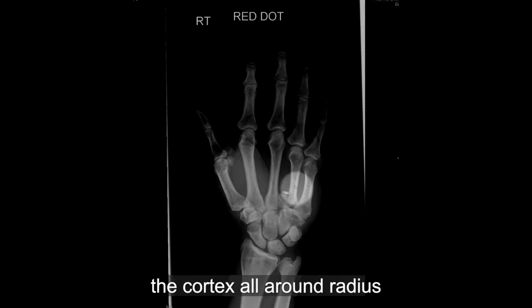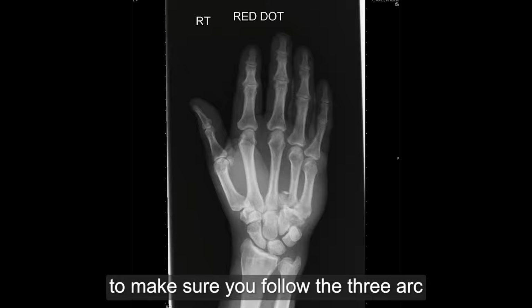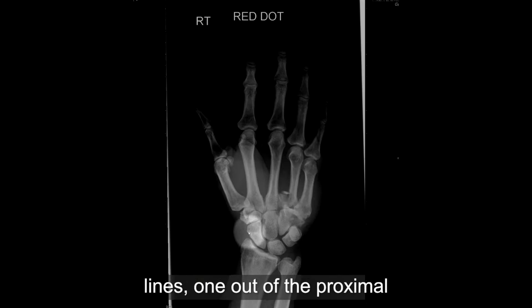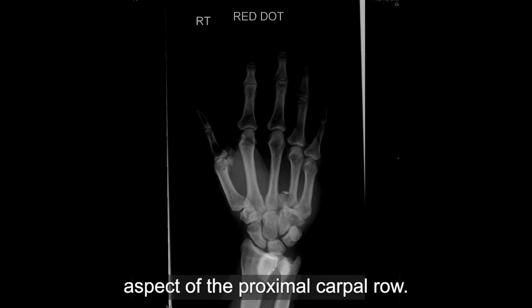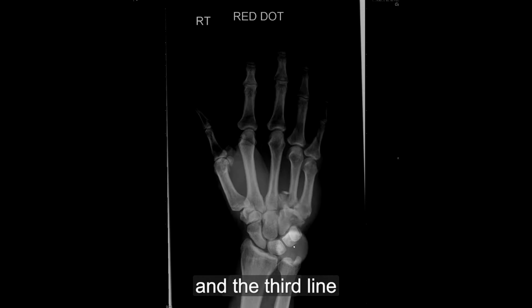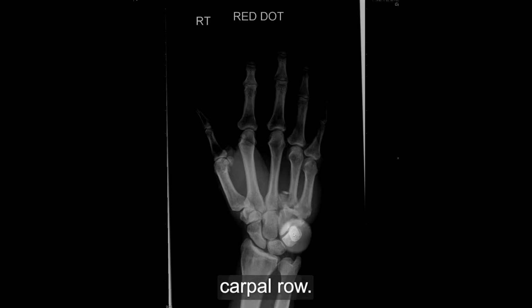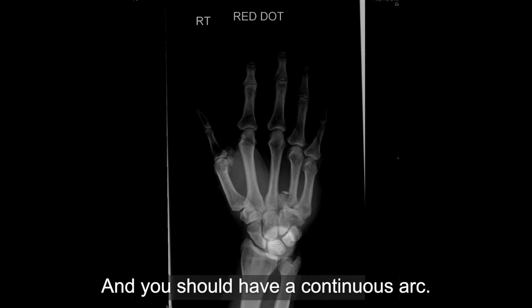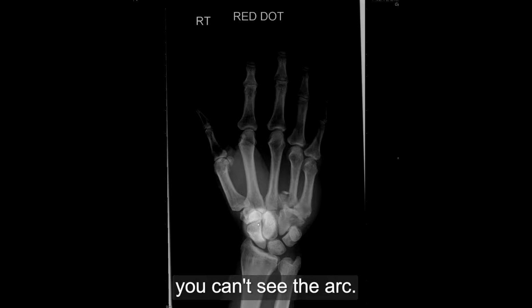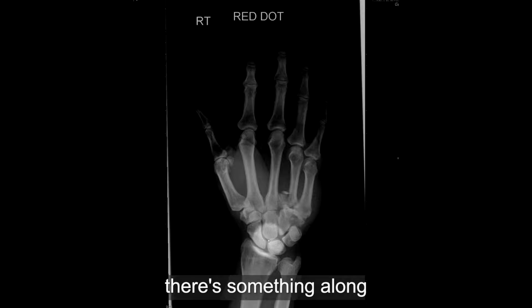You have to follow the bony cortex all around the radius and ulna, from proximal to distal. Make sure you follow the 3 arc lines: one along the proximal aspect of the proximal carpal row, the second along the distal aspect of the proximal carpal row, and the third along the proximal aspect of the distal carpal row. It should be a continuous arc. And as you come here, you can't see the arc, so there's something there. So we know now there's something along this side of the arc.